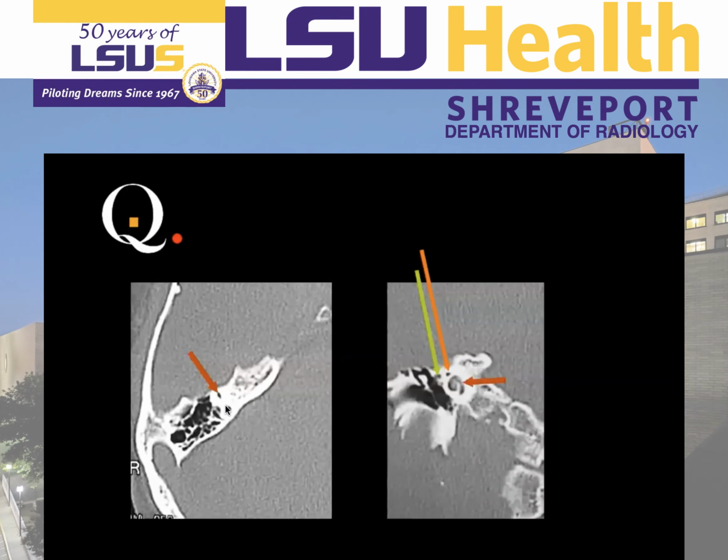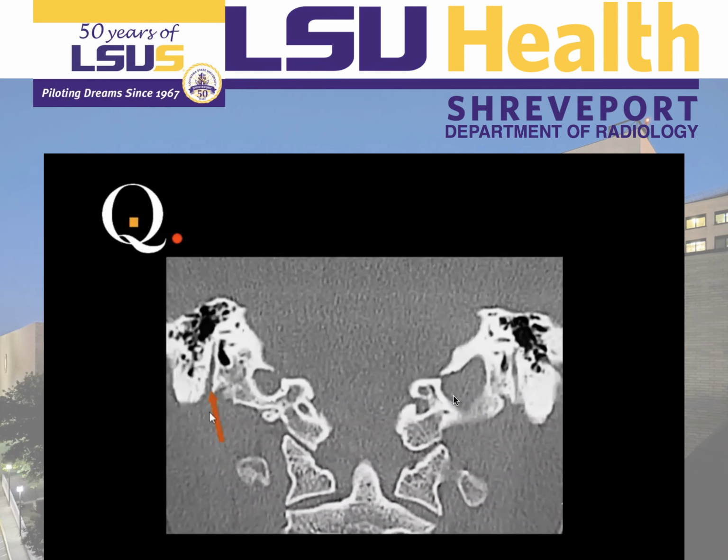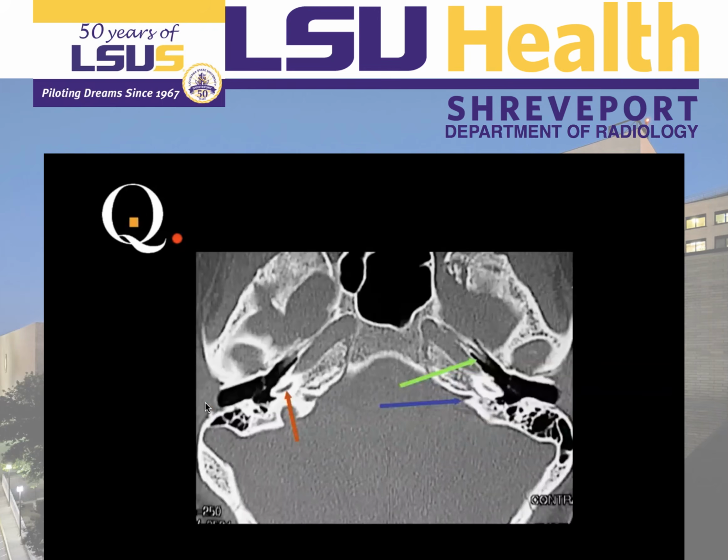Here we have the superior semicircular canal, and here the cochlea. Here the stylomastoid foramen. And this is basically for you to remember that is the Eustachian tube.